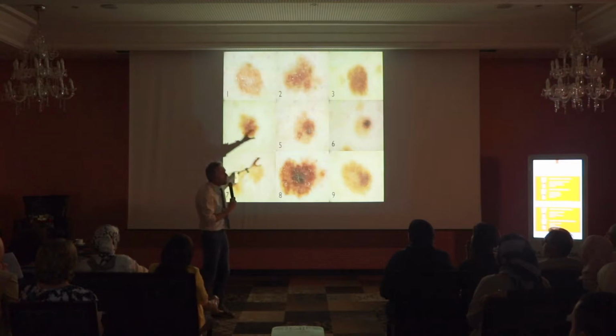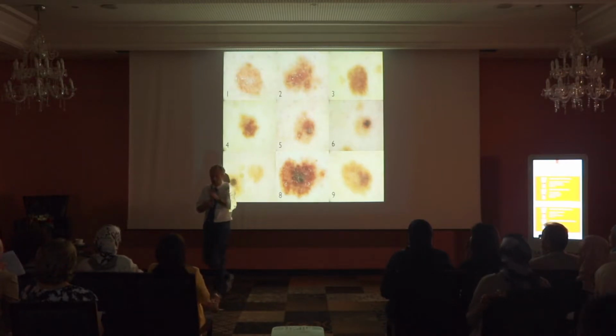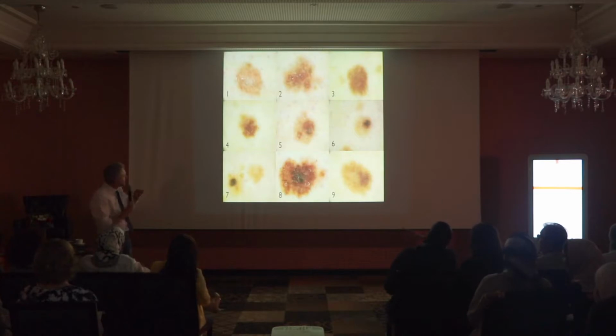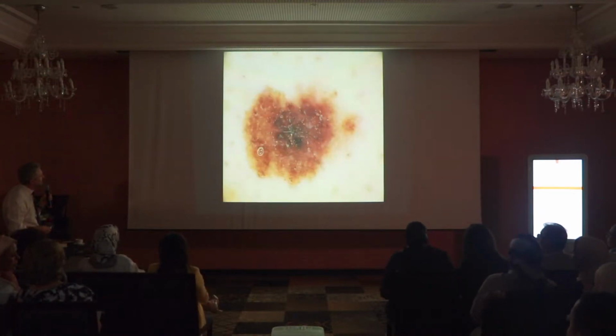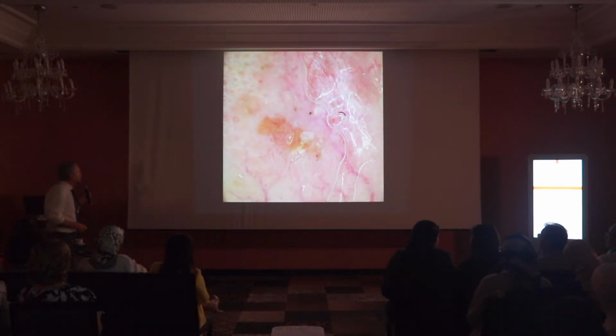If you choose 1, it's fine. If you choose 5, it's fine. We chose an 8. And this was histologically a nevus. So it was not a melanoma. There is no melanoma here because we cannot be in agreement that there is an outstander. Usually melanoma is an outstander. So here whatever you put on the paper is correct. This was the lesion we removed.